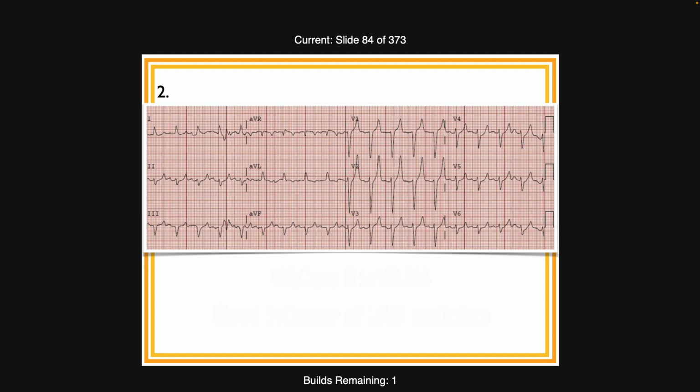Okay, Cody, number 2, please. What's most likely? What are the problematic T waves and for what reason? I'm thinking peaked T's. Okay, and where? I'm going to say V2. Okay, yeah. Where else? Potentially V1. Yep. So remember that peaked simply means sharp. I mean, definitely V2, no question. Definitely V1. I included V3 and V4, but certainly V1, V2 are enough. So hyperkalemia T's. Okay.